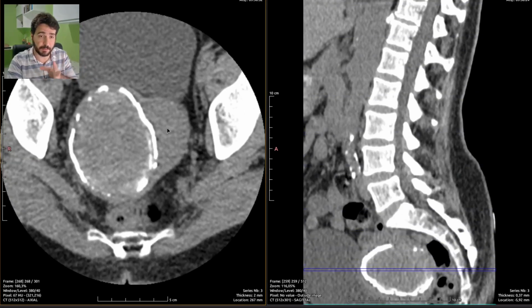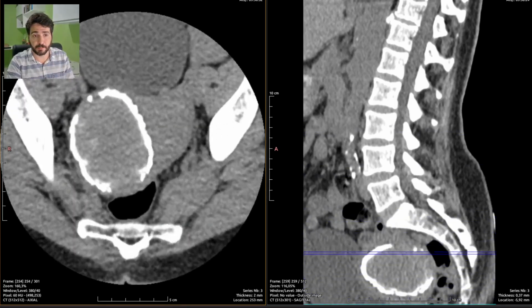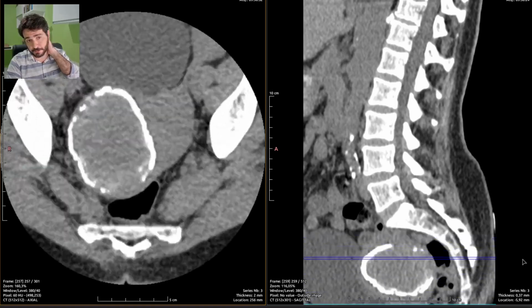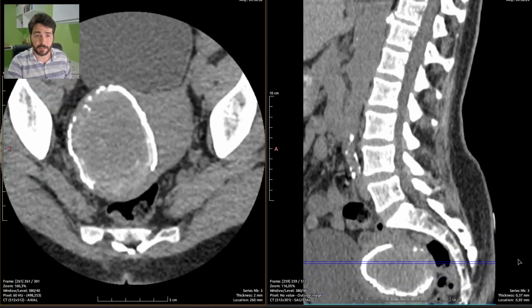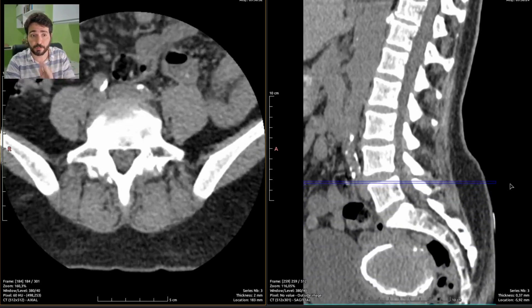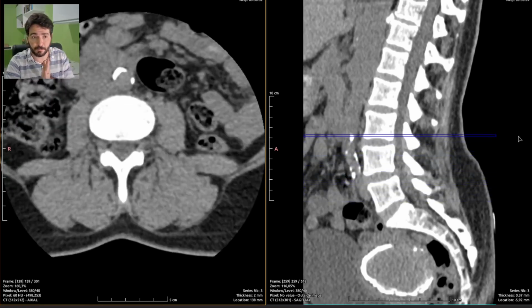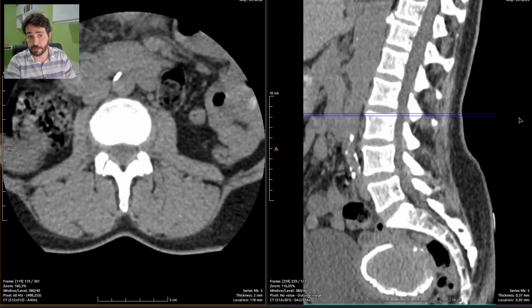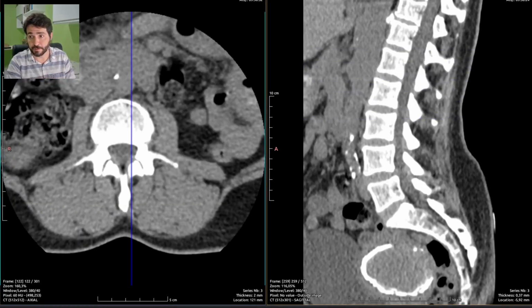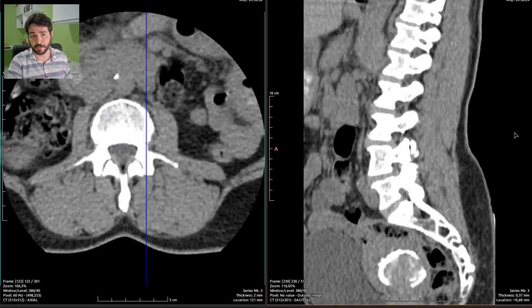This is a uterine mass, probably a leiomyoma, a benign, partially calcified uterine lesion. This is of less importance since this patient is in the emergency looking for a justification, a motive for her symptoms. So we have that motive, that reason here on the spinal, the vertebral exam. So let's keep focus on the actual exam.